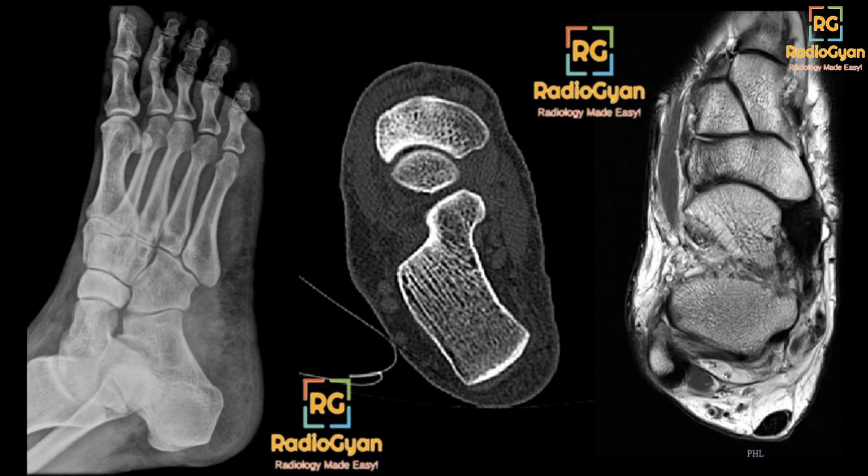Very good, Ashwini. You've pointed out the abnormality. So that's the first step, that you find the abnormality. Many a times in the exams, even if you're not able to get the diagnosis, what you can do is at least try to write the abnormalities. You may not get the full marks, but if the examiner is satisfied with your answer, he may give you at least partial marks. And sometimes what happens is that when we write down the abnormality, you may come to the diagnosis as you see that more. So good that you pointed out the abnormality.